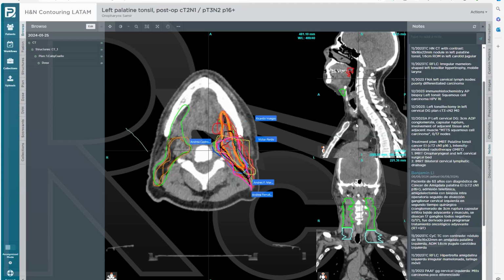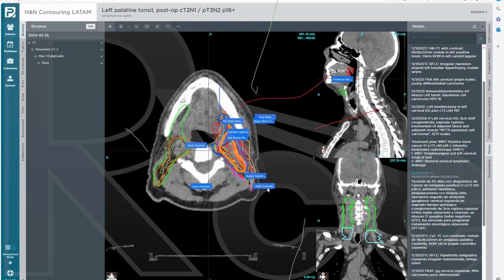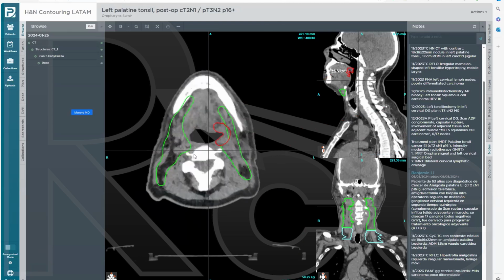Okay, a lot of participants, Dr. Patel. Okay, yeah, a lot of nice ones. Looks good. Some of them are also doing the contralateral. Yes, very nice. Looks good. So thank you everyone. This is good. So what if you want to erase, then I can just show how I would. Okay. Yeah. Thank you, Dr. Patel.